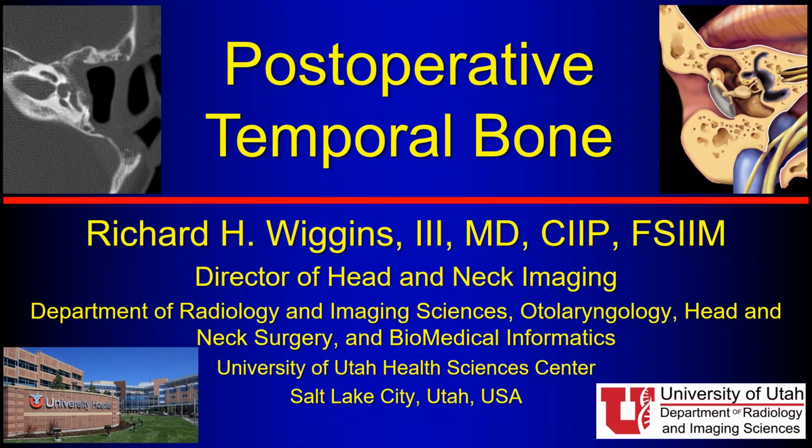But these are the kind of cases that 25 years ago were very popular to be taken off the stack and put down at the bottom of the stack. People would take out complicated temporal bone and soft tissue neck studies and hang them up on the viewfinder and then immediately pull them down and put them back at the bottom of the stack and hope somebody else would get to them later. Nowadays, they get left on the work list. Nobody picks them until the end of the day. Now we just leave it on the list.